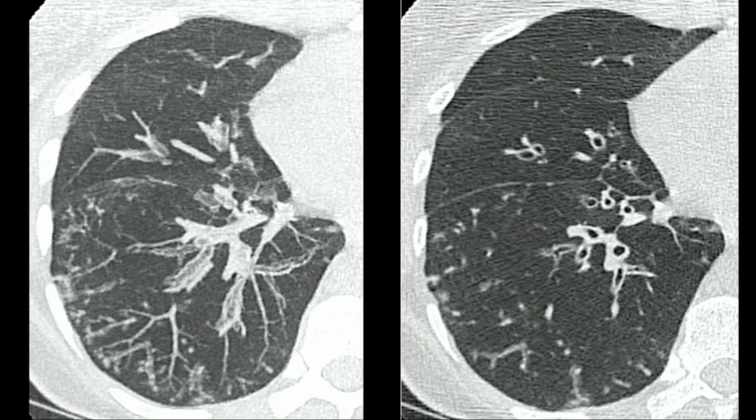This is an example of diffuse bronchiolitis showing tree in bud pattern. The image on the left is a MIP, which stands for maximal intensity projection, and makes the vessels appear like tubular structures, and allows you to differentiate nodules from vessels. Using the MIP can be a very helpful way to find nodules and see their pattern.